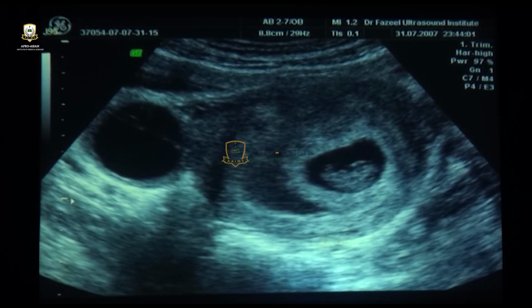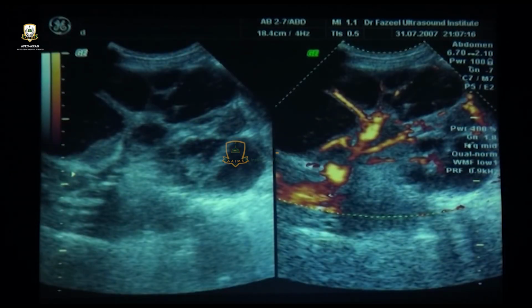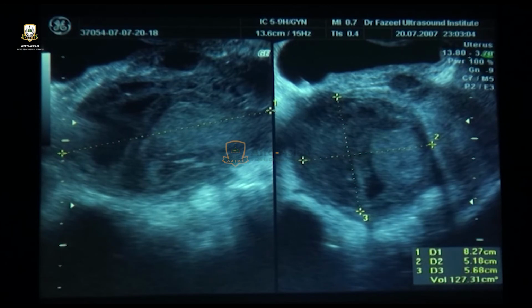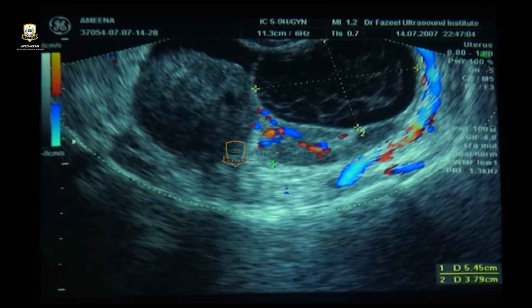You can see intrauterine fetus, and on one side you can see, what would this cyst be called? Corpus. That's right. This is a corpus luteal cyst with some hemorrhagic component. You can see the fishnet appearance there or clot. This is a malignant ovarian cyst. And sometimes an ovary can have endometrioma as well as a complex cyst. So both types can be in one ovary. This one is hemorrhagic ovarian cyst.